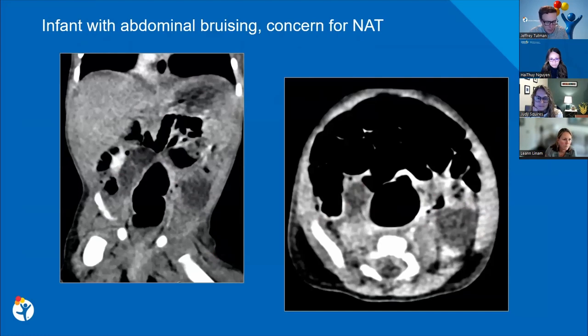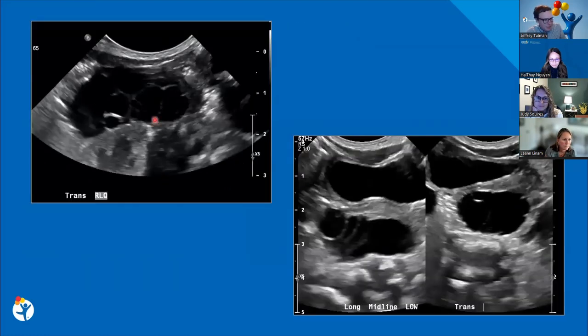But subsequently they had an ultrasound just to get a better look at those. This is very typical morphology for these. They ended up just being ovaries. I think that nicely shows that female infants can have maternal estrogen hyperstimulation. They can have all these big follicles, and their ovaries can be quite large. So keep that in mind when you're looking at these younger patients, that they can definitely have very enlarged ovaries.